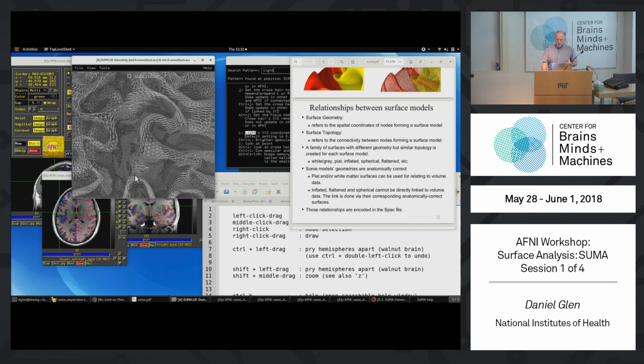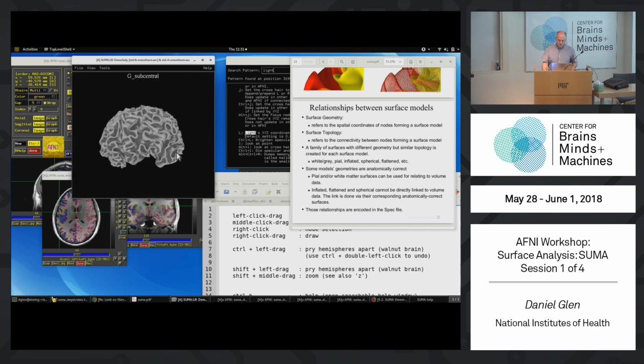How do we get to those surfaces? Let's do that. I'll zoom back out. If you hit P again, you can go through the mesh, and this is the point mode. Then there's a hidden mode where you don't see it at all, and then back to the original, the filled mode. So P cycles among the different modes.